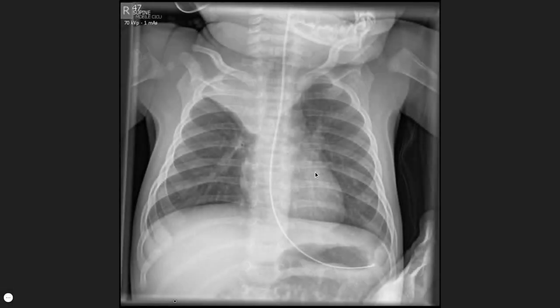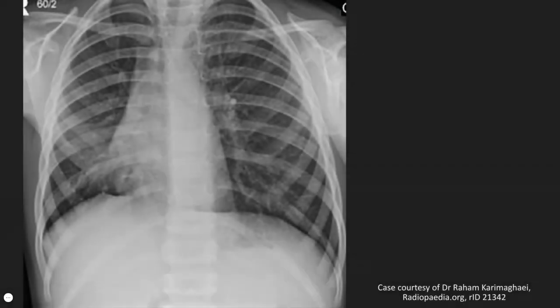In this patient, we have opacity in the right upper zone with elevation of the right horizontal fissure, and this would be in keeping with right upper lobe collapse. And on this example, we have loss of the right heart border with volume loss. The volume loss actually appears slightly worse than it probably is due to patient rotation. These appearances are in keeping with right middle lobe collapse. We don't have an example of right lower lobe collapse in this presentation, as it's similar to the previously demonstrated left lower lobe collapse.